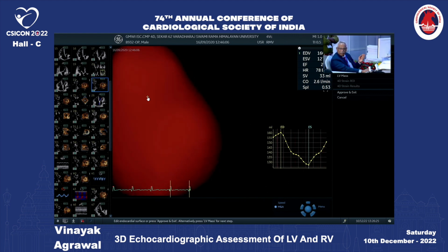There will be a few patients, about 10 to 20% of the patients, in whom the 2-dimensional echocardiography may not be good. You cannot improve it by doing a 3-dimensional echocardiographic picture. If your 2-dimensional data set is bad, your 3-dimensional data set is also going to be not correct. So you have to understand that. Any questions on these 3-dimensional echocardiographic volumes of the left ventricle?